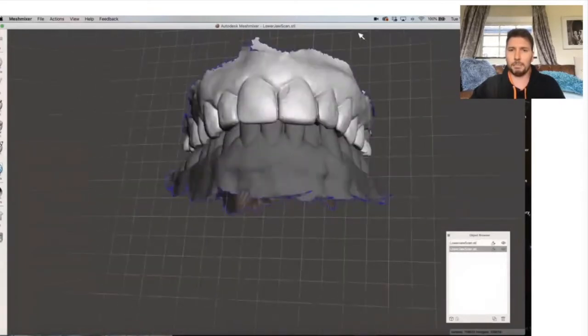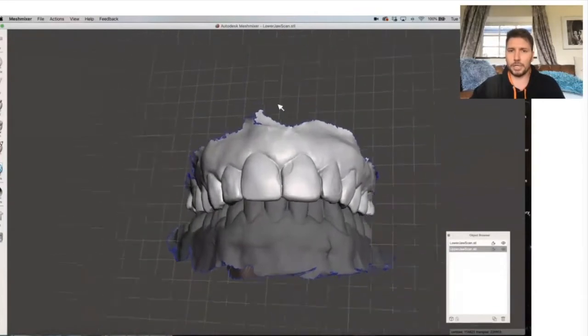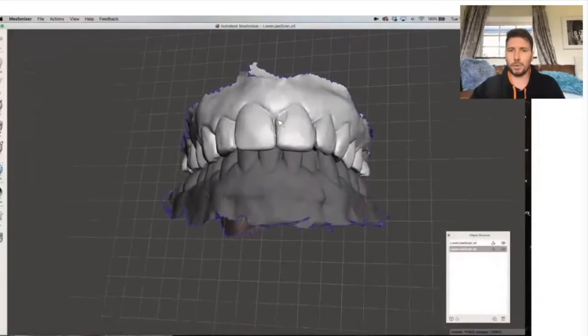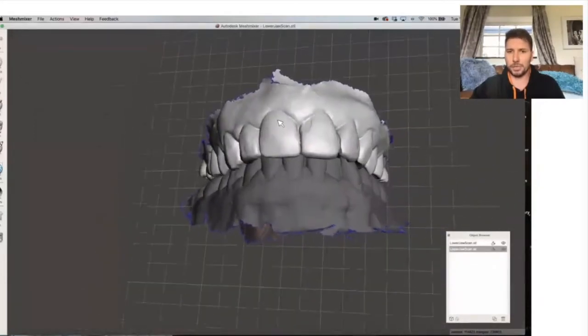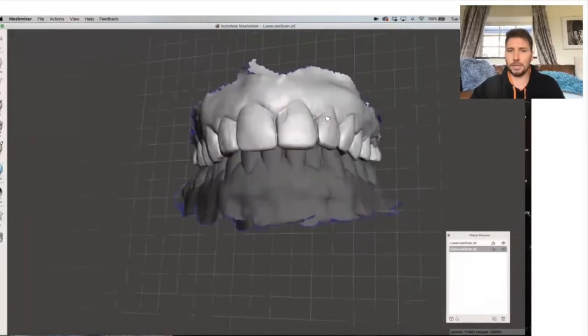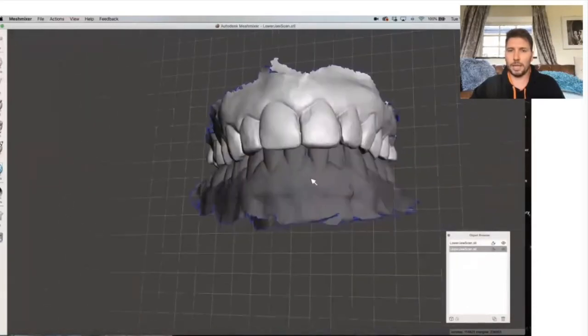Now, the middle mouse button is also the button that I'll hold down and click to move the object around in 3D. So I'm holding the middle mouse button down, which is the scroll wheel, and moving that around. Right button, rotate, middle button, move, left click, select, okay?